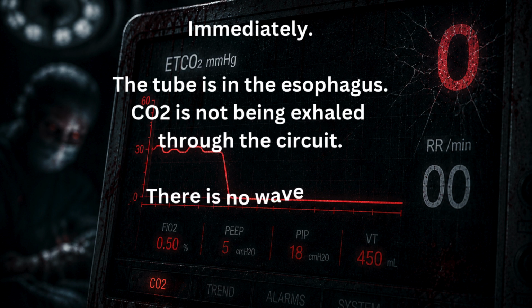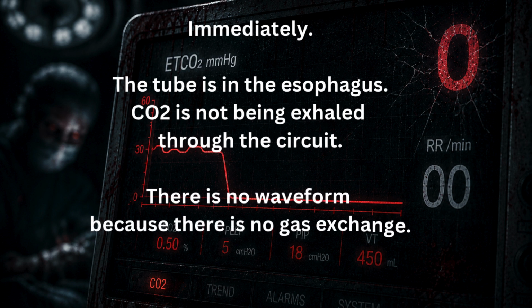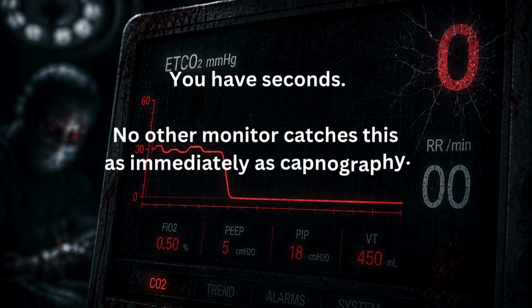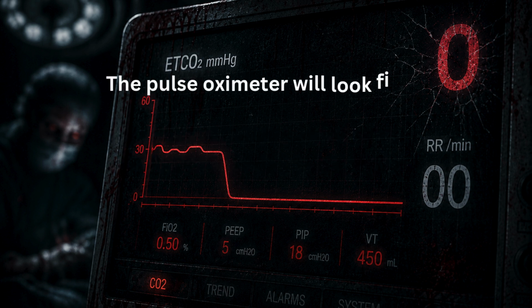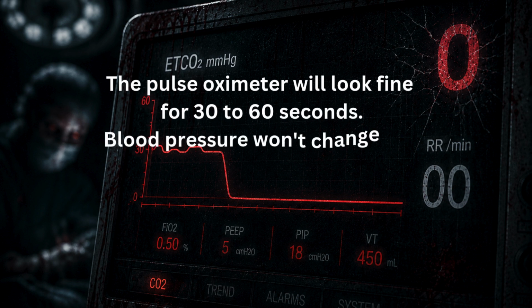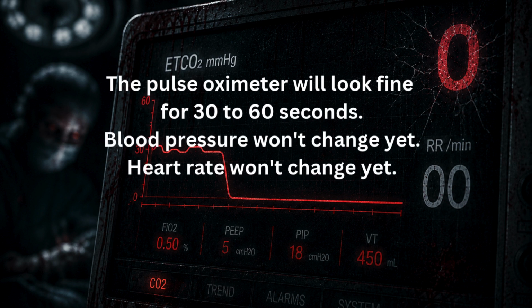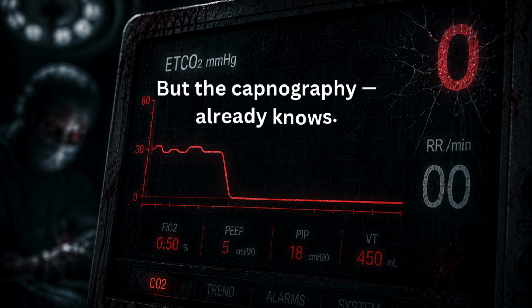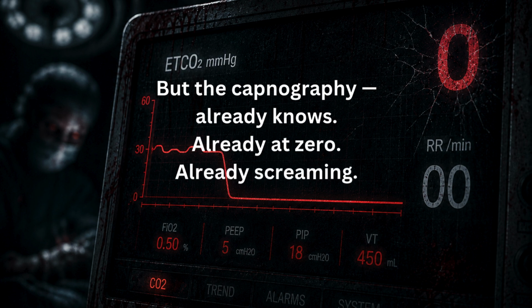CO2 is not being exhaled through the circuit. There is no waveform because there is no gas exchange. You have seconds. No other monitor catches this as immediately as capnography. The pulse oximeter will look fine for 30 to 60 seconds. Blood pressure won't change yet. Heart rate won't change yet. But the capnography already knows, already at 0, already screaming.